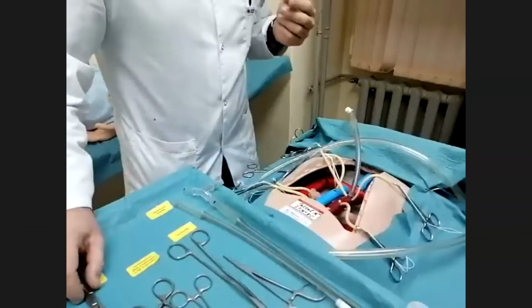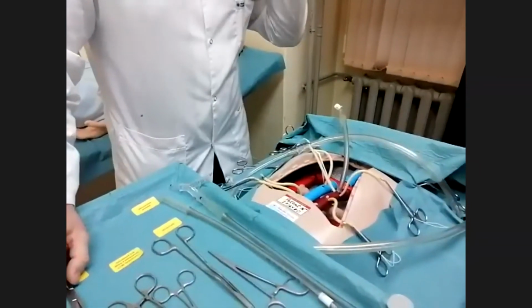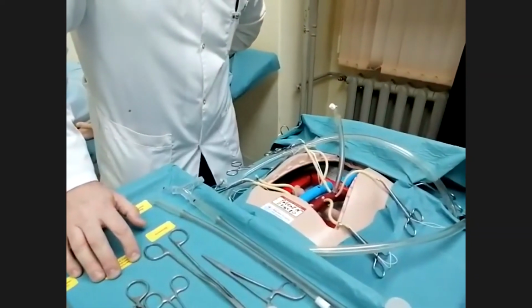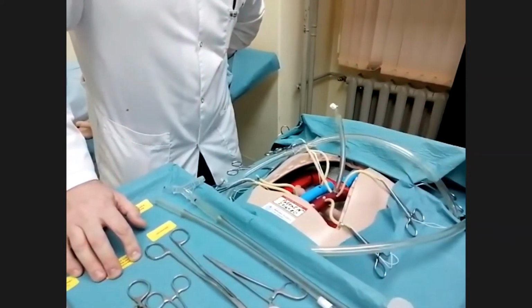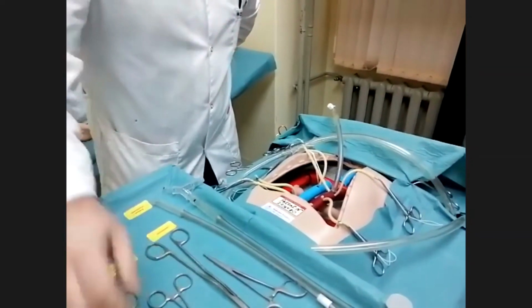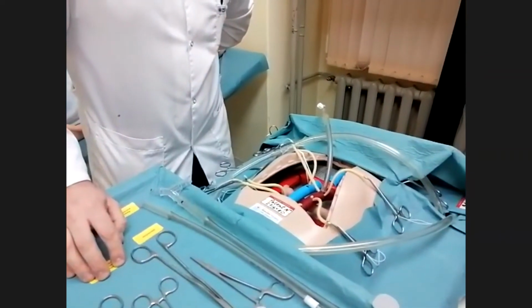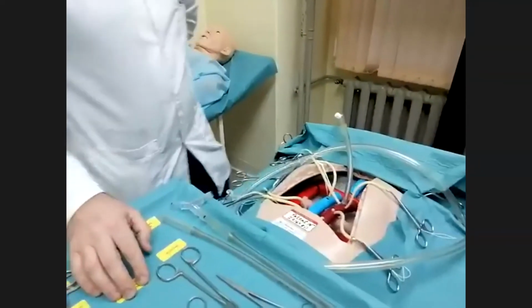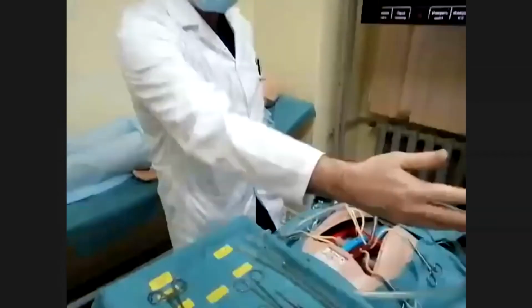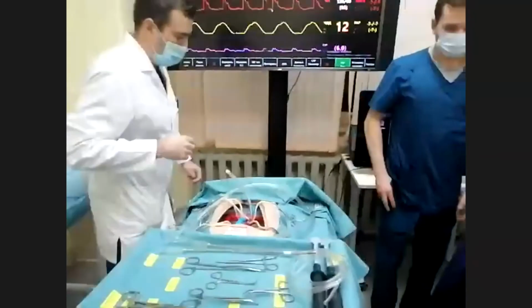If I understood you correctly, you said if you're going to use the simulator with a liquid, is it optional? So it might be with liquid or always dry. Yes, it's optional. So how does it work with liquid? Is it going to be a pump or motor somewhere? Yes, using the pump of the real cardiopulmonary bypass machine. I can show you the pump here.